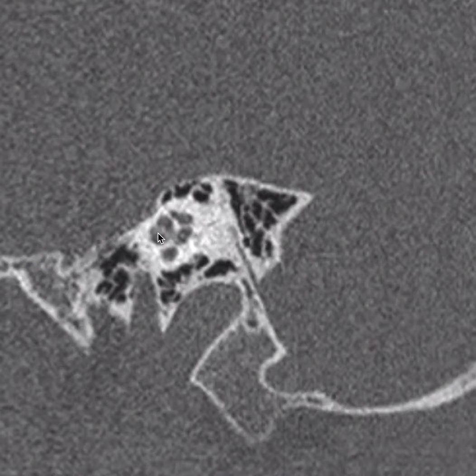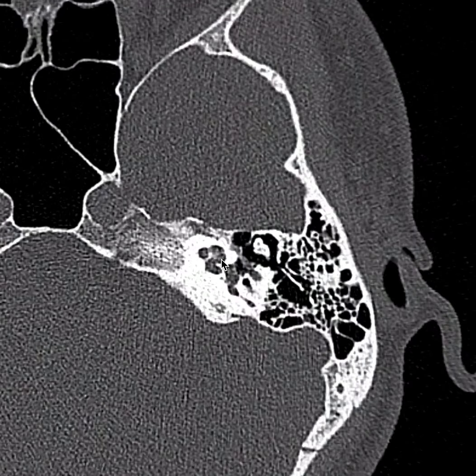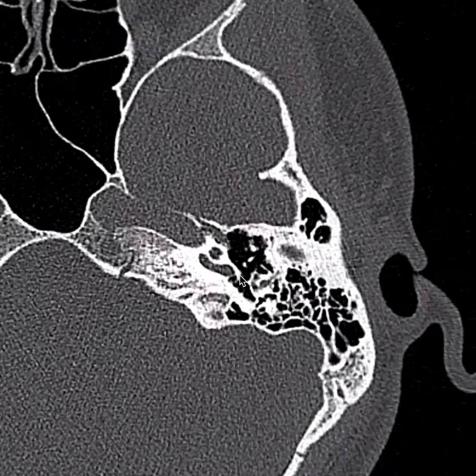Let's go ahead and turn now to our axial CT images to review these same structures. Here again on axial CT, we can see our cochlea with its basal turn right here. An interscalar septum here divides it from the middle turn, and as I go further superiorly, we'll see the apical turn divided away from the middle turn by this additional interscalar septum. The interscalar septae will all converge on the modiolus, which is the central bony structure seen here. Because the apical turn does not make it around 360 degrees, in total, our cochlea only has between 2.5 and 2 3/4 turns.